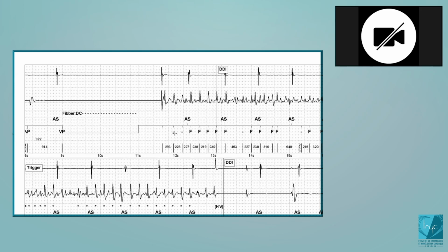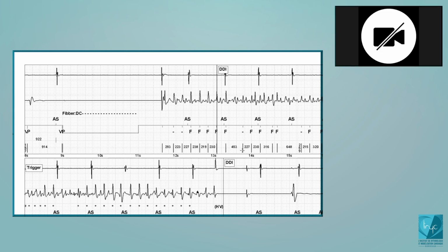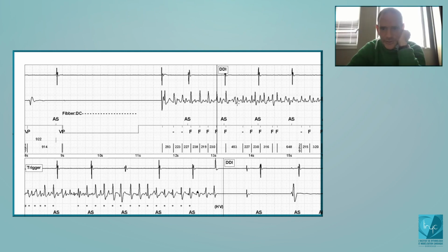All the time, at the onset of the tachycardia, the first cycles are unclassified because the current intervals are fast, but the average value is still slow. And then one cycle is classified F. What happens here? We can clearly see that there's an undersensing, explaining that this could be a transition for the device. You're fast here, and then you're slow. So that's a transition between fast and slow, and that's why this one is unclassified. But as you see, this corresponds to a cycle which is undersensed. Okay? And then?